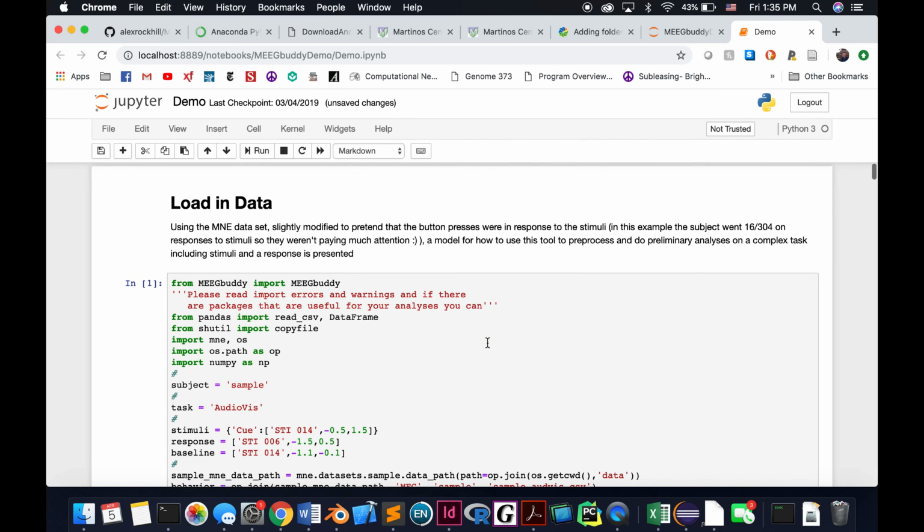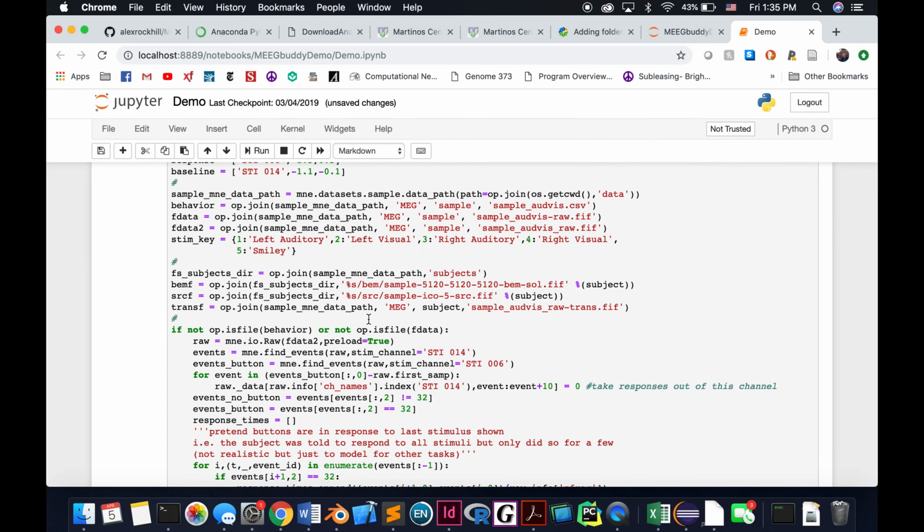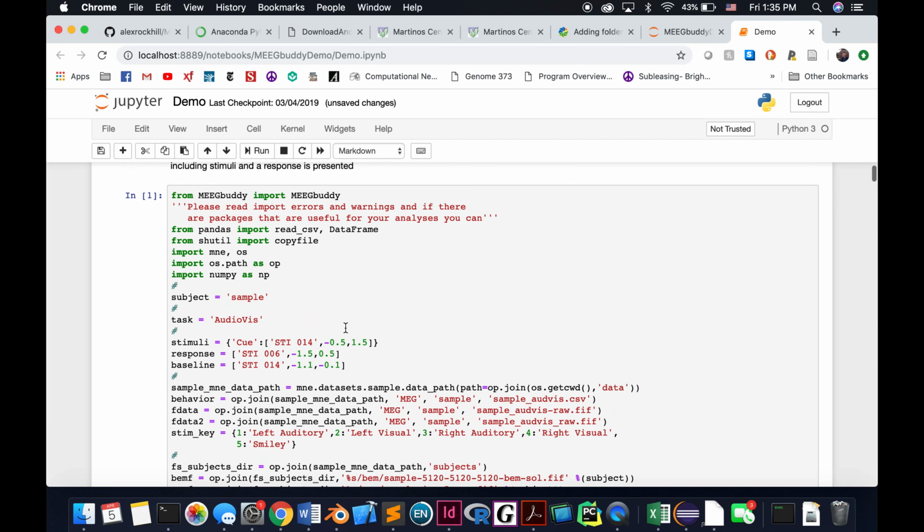The next demo will pick up here, and this will be the demo for the EEG analysis, pre-processing and analysis. After having all the requirements downloaded, the next demo should be for TMS-EEG, specifically using that consciousness analysis notebook that was in the other folder.